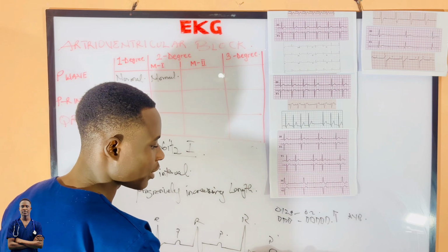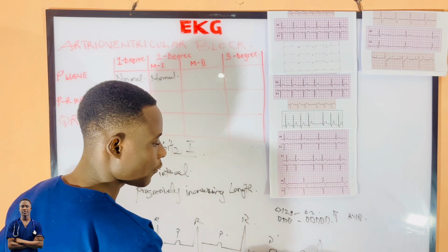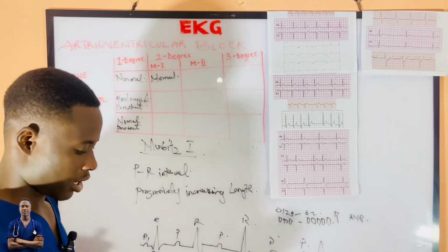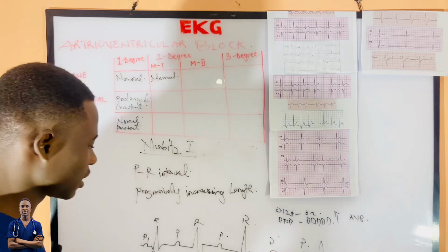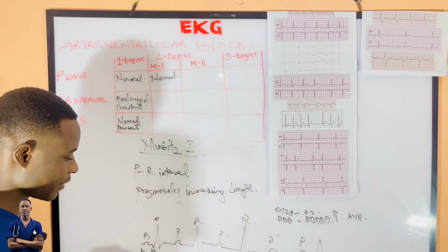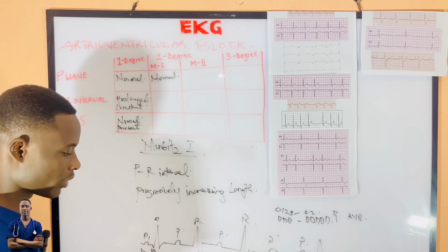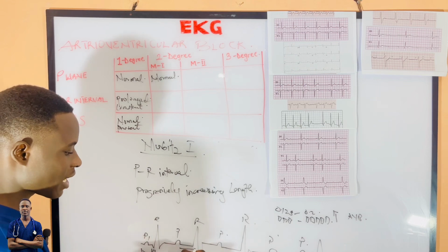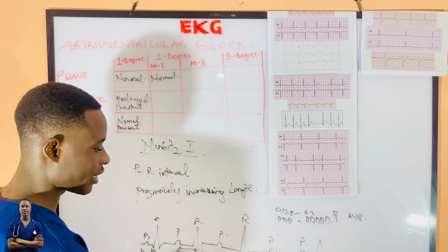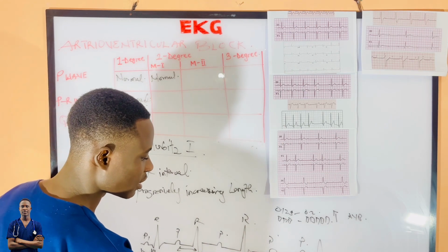wave without a QRS interval. Are you clear with it? Now, assuming this, the time taken for the PR interval here is 0.24. Here, for this part, it will be 0.28. And here, it will be 0.32. And then here, there will be what? A drop in beat.